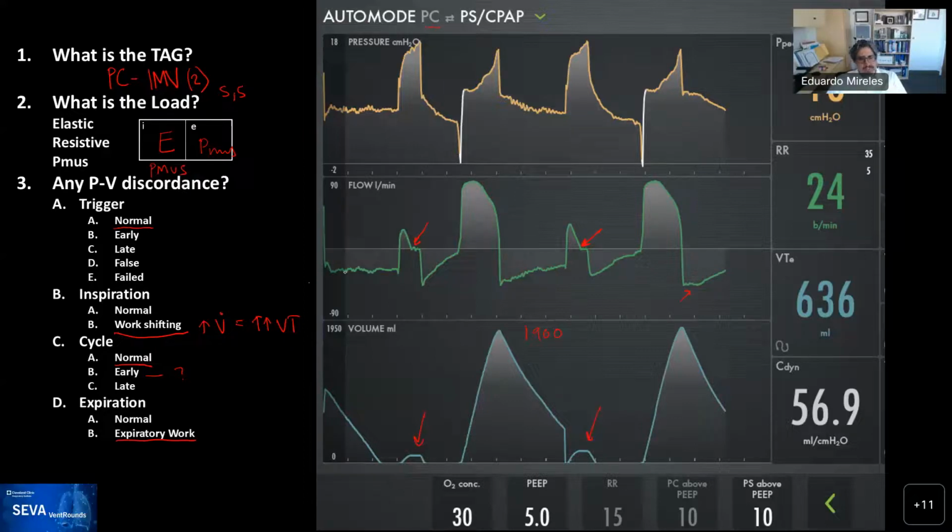And when I see this flattening of the flow curve, it makes me think if there's obstruction in the patient, that there's a sort of flow limitation, and the patient cannot get through, and so it cannot achieve the aim, which is to breathe the air out as fast as they can because they have obstruction. That's what it makes me think. They could probably feel that. Maybe he just needs to be suctioned. Who knows, right? Yeah.